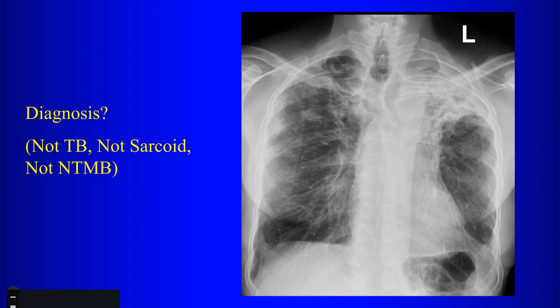I'm asking for a diagnosis on this chest x-ray. I will tell you it is not TB, it is not sarcoid, and it is not NTM. What does NTM stand for? Non-tuberculous mycobacteria. Right. What's the finding on the chest radiograph? Those were all my guesses. Oh, yeah, that's exactly right. That's why I put them up there so we wouldn't waste time.